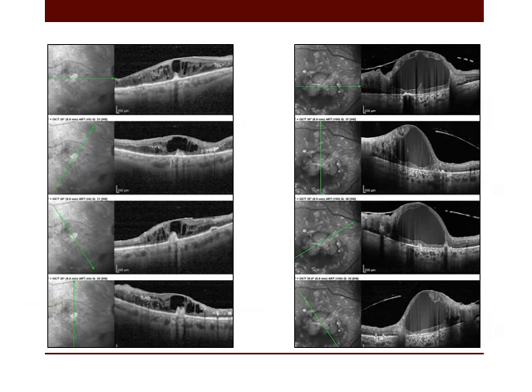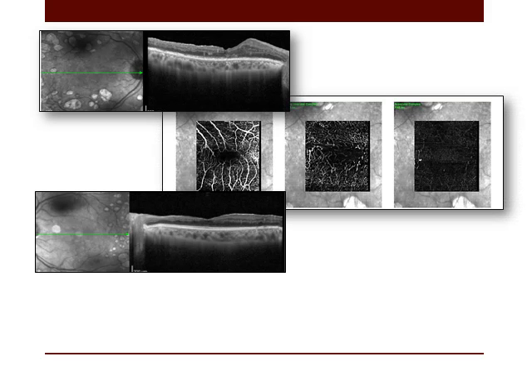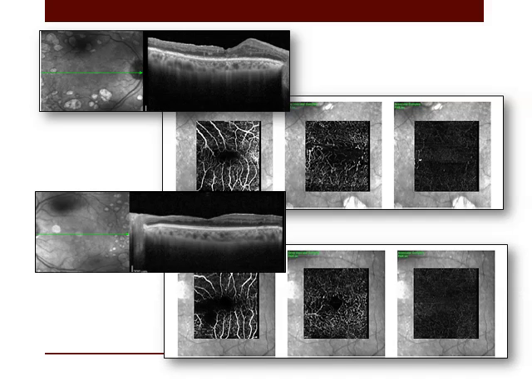In this patient, the presence of a cystoid or degenerative cyst carries bad prognosis for the patient. This is a very large cyst that even if it collapses with the therapy, the prognosis will remain bad for visual improvement. Presence of vitreomacular traction, disorganization of the retina in inner, middle, and outer retinal surface, retinal structure carries bad prognosis. With the left eye, you can see there are marked ischemic changes in this eye. However, the right eye preceded it in the ischemic changes.